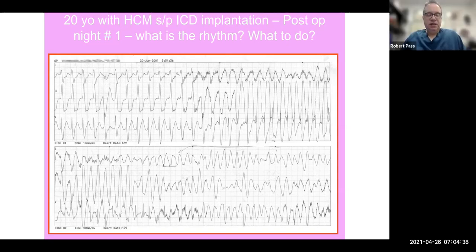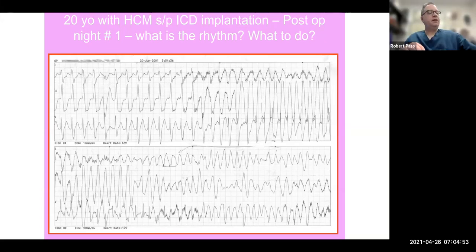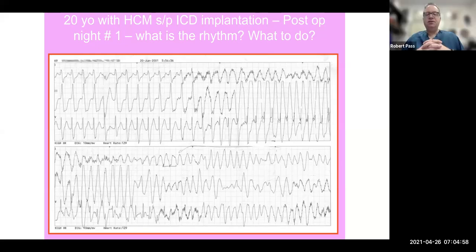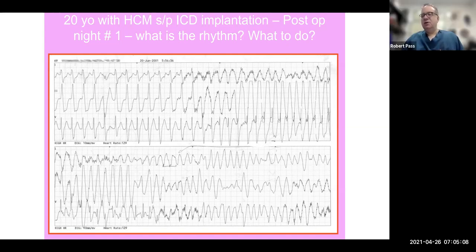Right. So, is this a long enough period of time for the device to have fired? Can you tell from this tracing? I cannot tell exactly. Is the strip underneath just a continuation of the one above? Yes, it's a continuation. It takes about 8 to 10 seconds for the. How do you program an ICD? You said it takes 8 to 10 seconds. What is that based on?